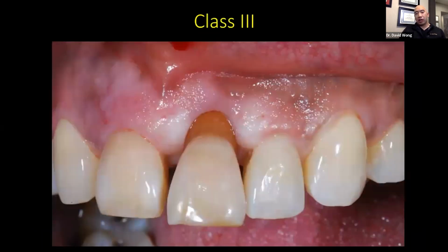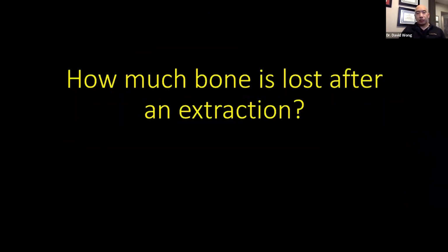This is that no-brainer, another no-brainer I was telling you about. The tooth has 4 millimeters of recession on it, and there's also no bone. So in that situation, you have to phase out your treatment. You have to build up the bone and soft tissue first before you place your implant.